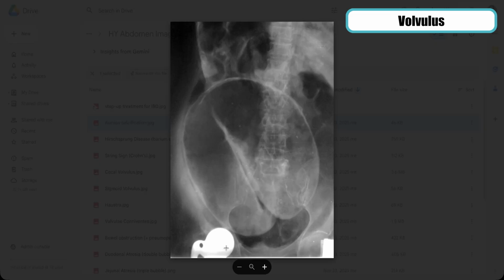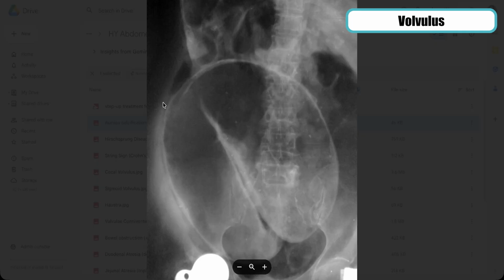You got this bright white structure down here. This is actually a femur arthroplasty. This is probably a hemiarthroplasty because you don't see the acetabulum being replaced either. It's just the femoral head and beyond. And you can actually see, if you look really closely here, you'll see this fine white line.